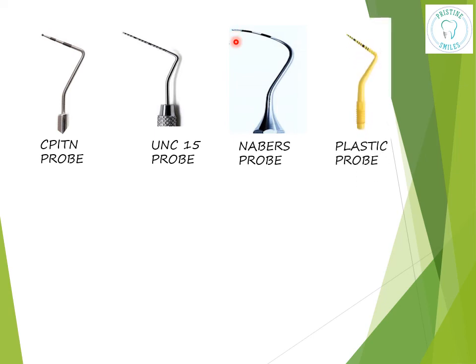We also have plastic probe which is used for implants. The implant probes can be plastic or non-metallic type. The main aim is to ensure that there is no damage to the abutment surface.